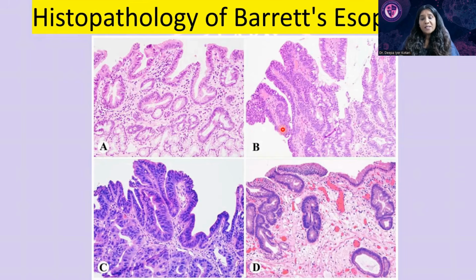A distinct transition between non-dysplastic and dysplastic mucosa may also become evident in some of your biopsies if they have both the areas. But you have to remember that in low-grade dysplasia, nuclear polarity is definitely maintained. There is no lack of polarity. Architecturally, the glands usually retain their normal configuration without the complex patterns such as cribriforming. And there is no severe pleomorphism in this case.